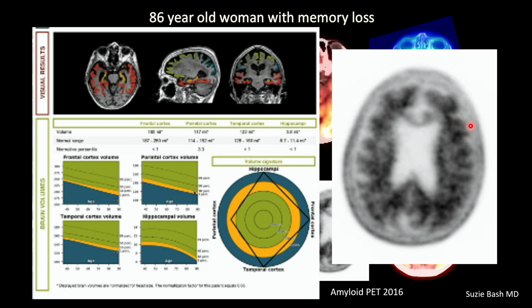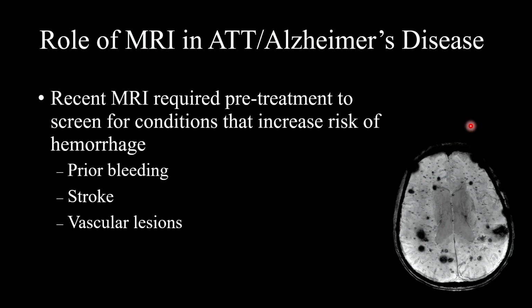Is this positive or negative? Does it mark the white matter or go all the way out to the edge of the brain? This goes all the way out to the edge of the brain. This is a clearly positive case.